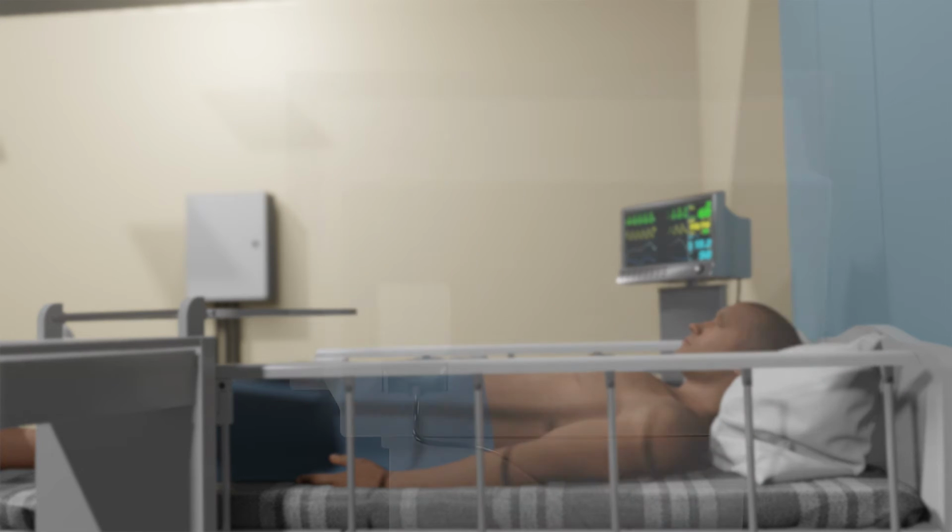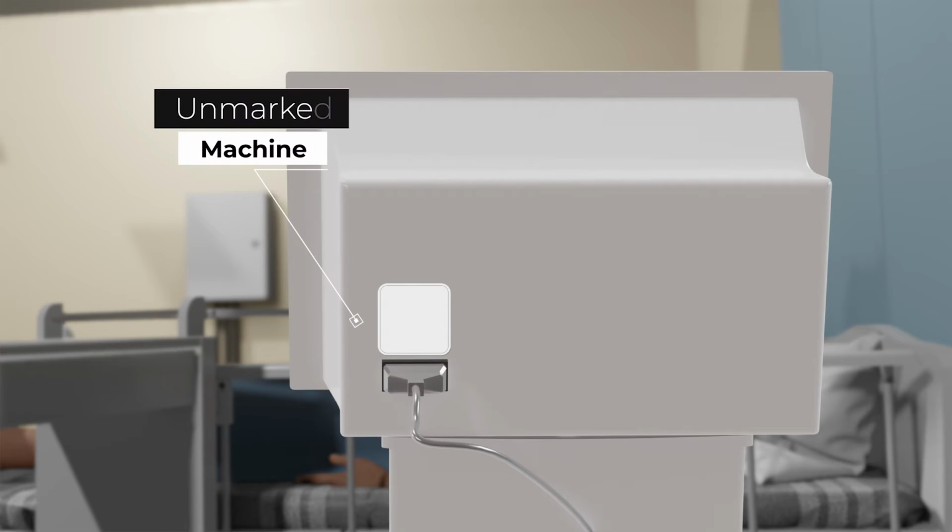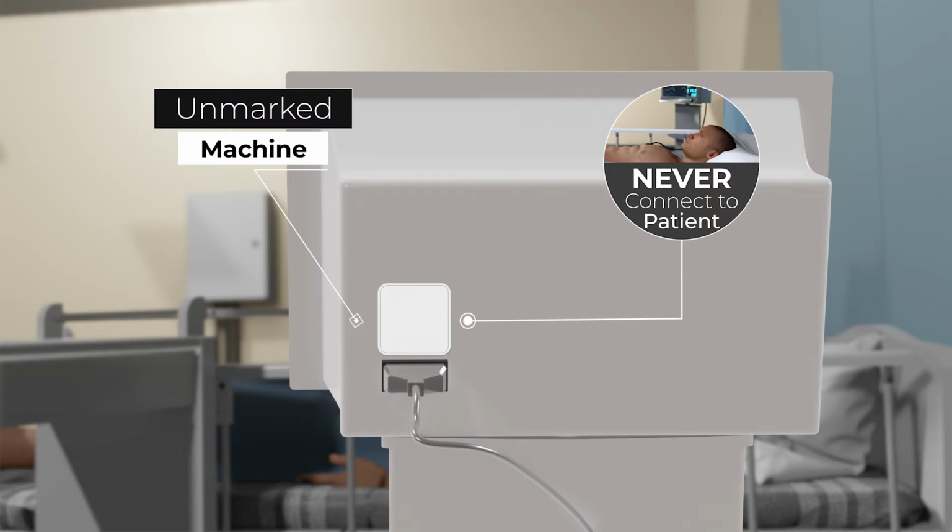Electrical equipment that is not specifically marked for use in clinical applications may not be connected to any patient, especially when other equipment is also connected to the patient.